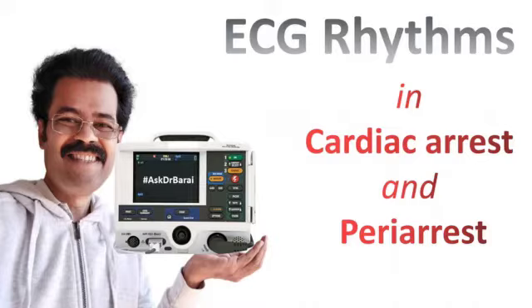We need a very good, thorough understanding of all these ECG rhythms to give the best available care to patients. So let's show how these rhythms are seen on the defibrillator machine, and also talk about how we can manage these conditions.